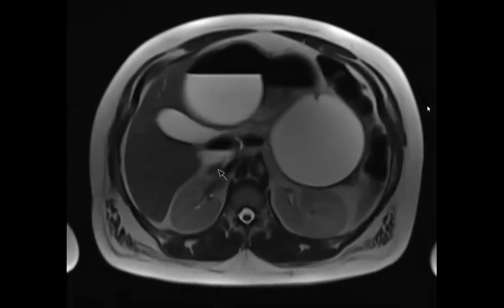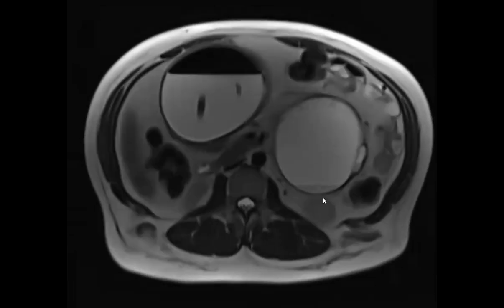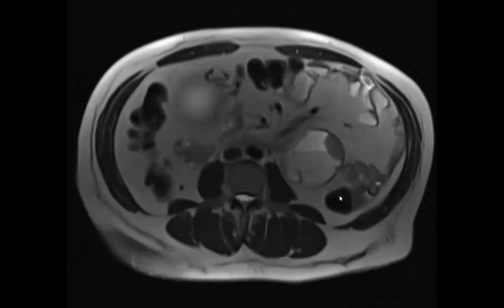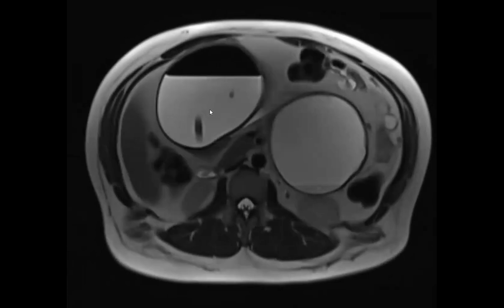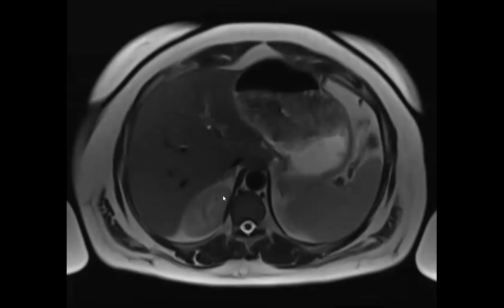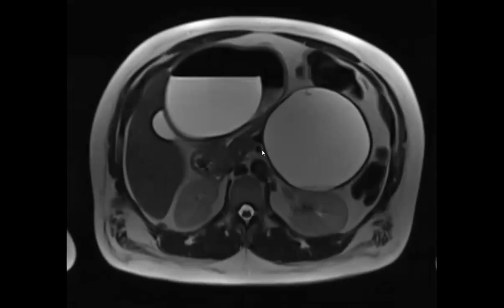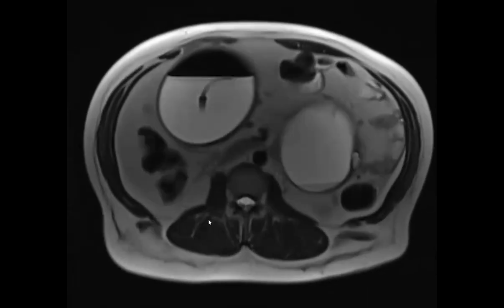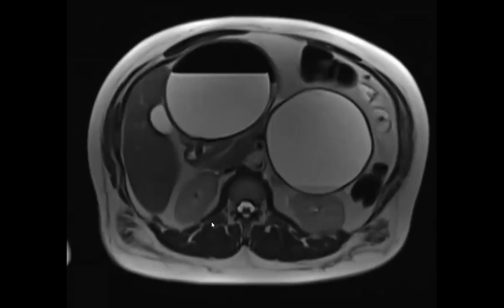Okay, so this patient, ignore this. This was actually a large pseudocyst with some debris in it. Okay, so that's just a distracting feature, but I want you to focus on this guy over here. So we've got stomach, we have some debris in the stomach, and then we have this fluid-filled structure. Is that a feeding tube going into a duplication cyst?